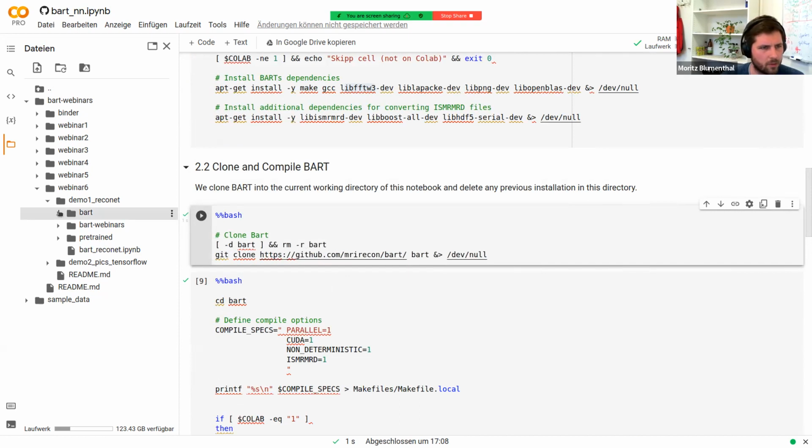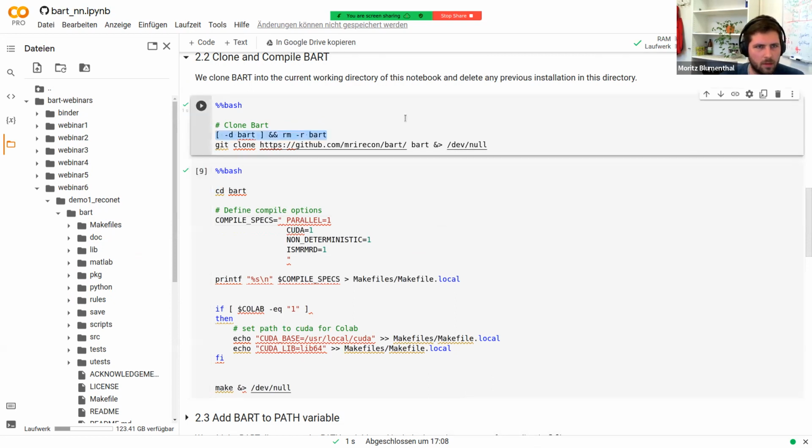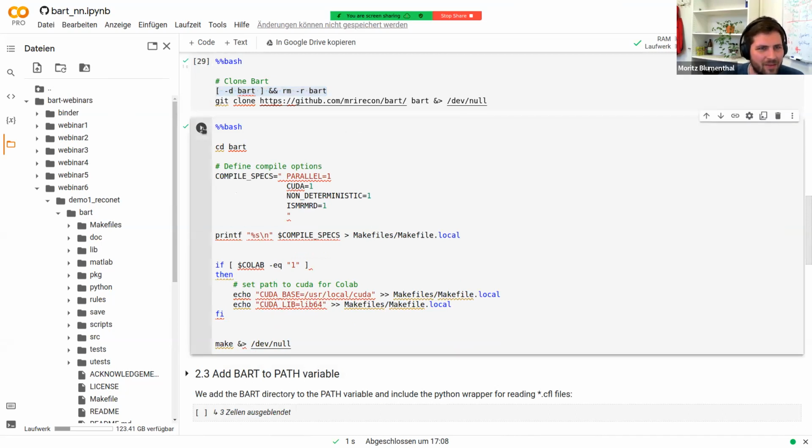I'm confused why that is all so fast now. Just interrupt me if it's slower for you. So it's a little bit slower on my end. I think when you run it once, you might save it to your Google Drive, and that might be why it's already downloaded. I think so. Yeah, but actually here, although you remove it, yeah. I remove it and go back to it. So I'm a little bit confused why it's so fast. But maybe now that takes hopefully some time. So to have it in the real world case.